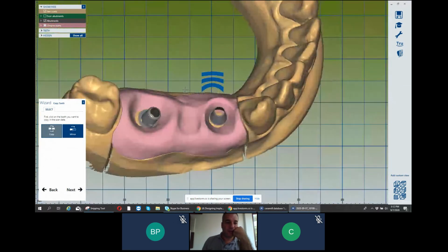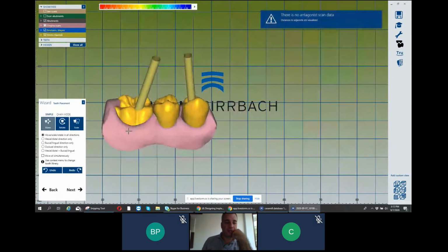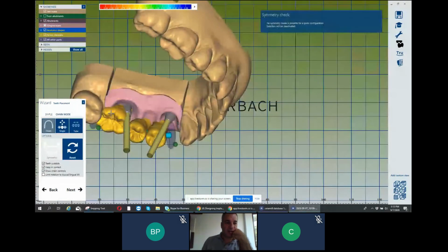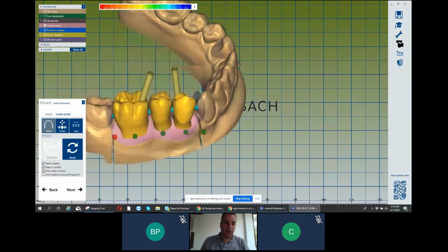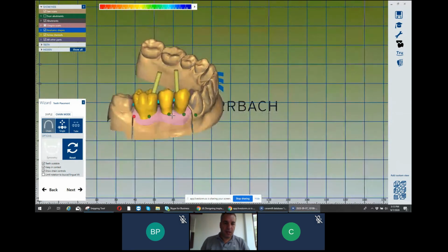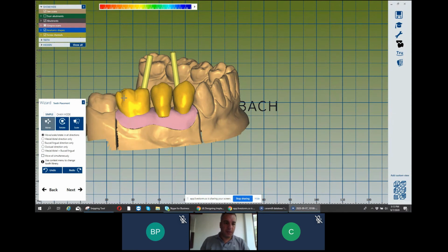Here, if you need to, for mirroring, I don't care. We should place the teeth in position. So, the easiest way, I choose chain. I start with the first contact. I fix it. I go for the next contact. So now I have the teeth in position. Also go for simple, position your teeth, whatever.